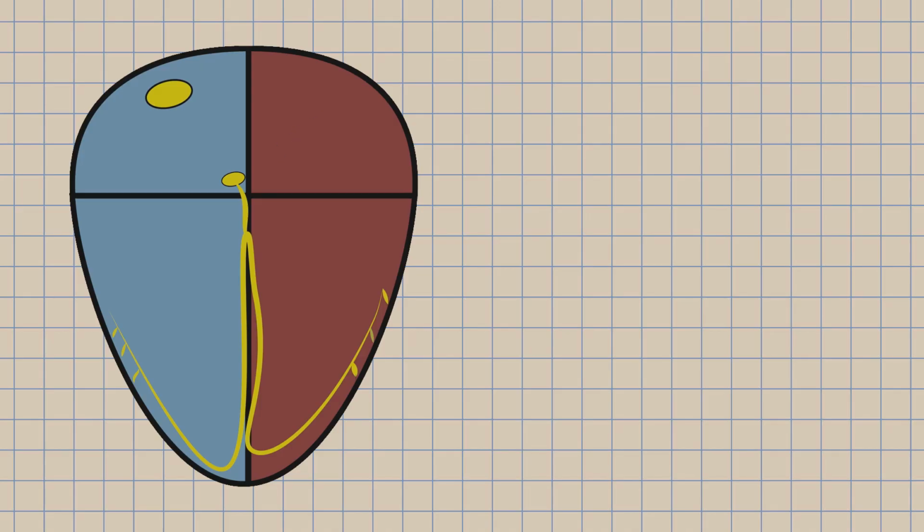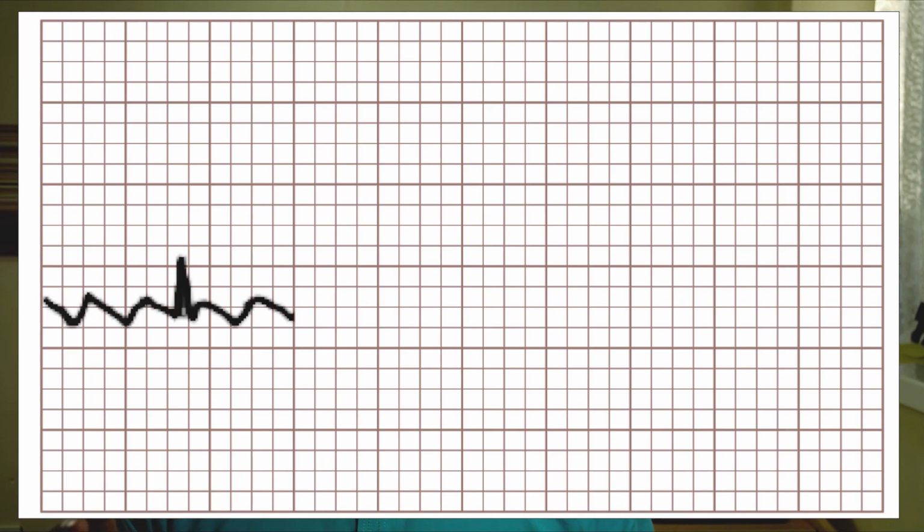In an atrial flutter, however, because it has one focus of electrical impulse, you can see some broad waves. They are not your classical P waves. These are sawtooths. Because of the rapidity of the discharge, as one sawtooth ends, another one begins because there is no break in between them. Think of Eminem. You don't understand anything. That is how fast your heart is going. Not every sawtooth is followed by a QRS complex. This is due to the controlling activity of the atrioventricular node. But unlike atrial fibrillation, you don't see noise on the baseline because the focus is one and it's more organized than multiple foci going off in an atrial fibrillation.